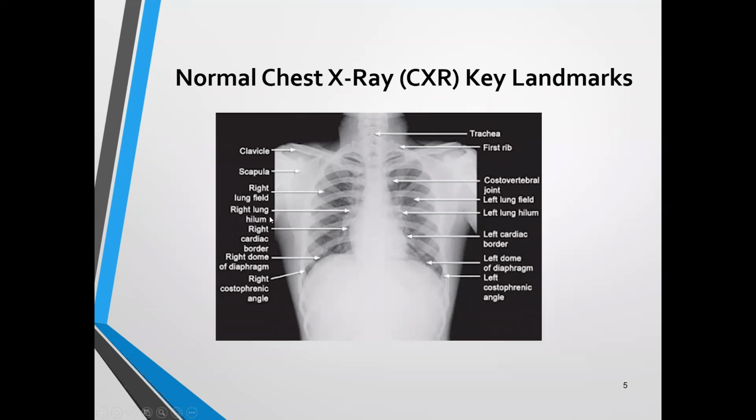So right now, I'm looking at that about halfway down, where I'm using my cursor to show you. The hilar region is where the main stem bronchi go into the lungs, but there are also vessels, so arteries and veins. There's also lymphatics. So it's this area of convergence of, again, blood, lymphatics, air, etc. So we're talking about that hilar region. They were demarcating the cardiac border and this cardiac silhouette, if you will. So you have the left border and the right border there.